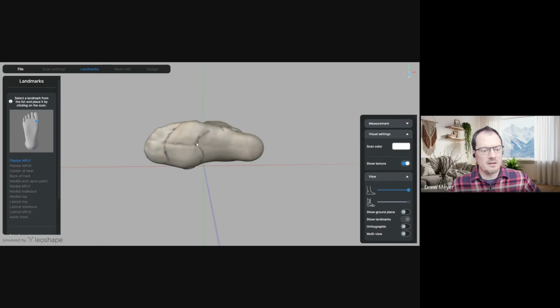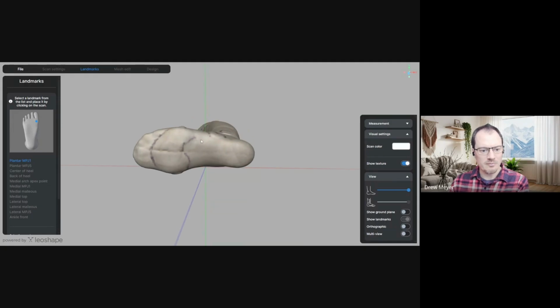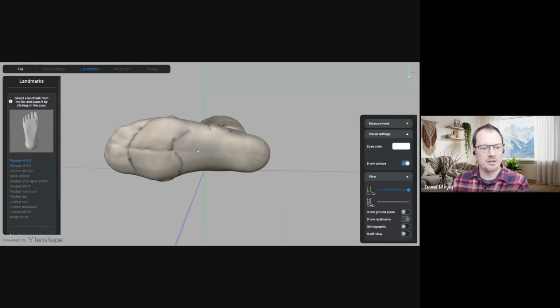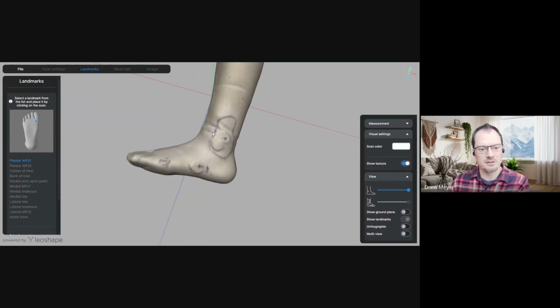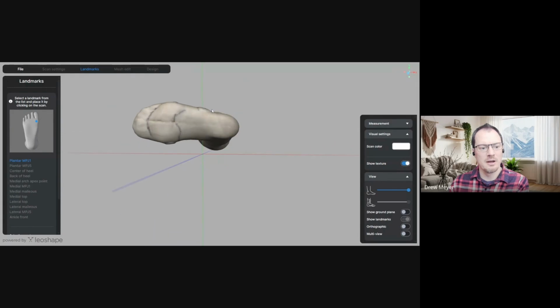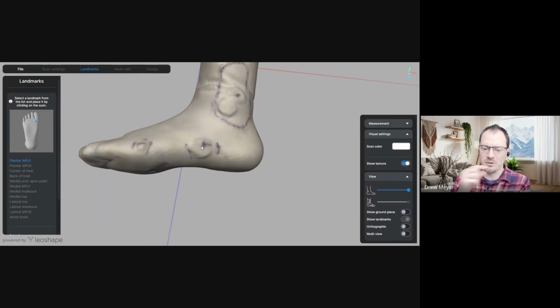And then this is one of the things, just kind of pointers that can help you on your digital journey here. If you have an OBJ scan and you have marks, it will help you find your landmarks or find your buildup locations. Like I circled, where do I need to add some material here? Additionally, I use these little foam stickers. I've seen people even use googly eyes or things from the craft store. It doesn't really matter what it is. Play-Doh even. I've seen people put Play-Doh against the skin and then wrap it with some plastic wrap.